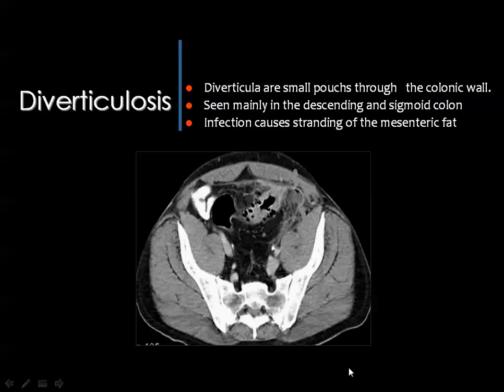You know that the diverticular disease of the colon is one of the common lesions seen in clinical practice, and diverticuli were usually diagnosed by barium enema, but now they can also be easily diagnosed by CT and by MRI. You can see multiple air pockets in the wall of the colon, especially the left-sided colon, diagnostic of diverticular disease of the colon.